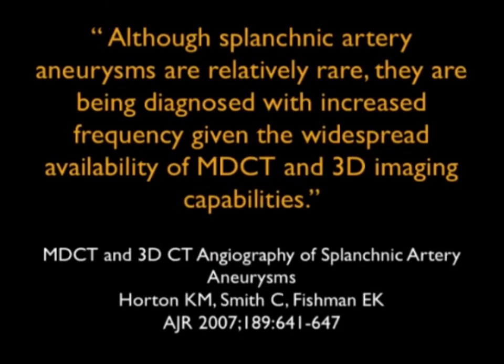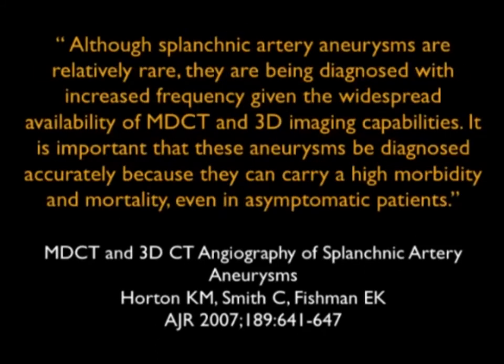We've written some articles on this subject, mentioning, of course, that being diagnosed more frequently with faster scanning and thinner sections. It's important to recognize that these aneurysms can be diagnosed accurately, but it's important because they carry a high morbidity and mortality rate, even in asymptomatic patients. Often something will need to be done, whether we're talking about resection or we're talking about embolization.